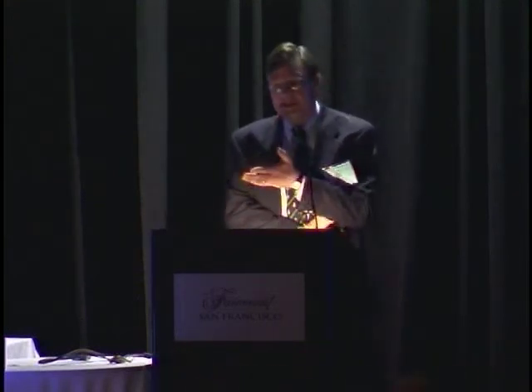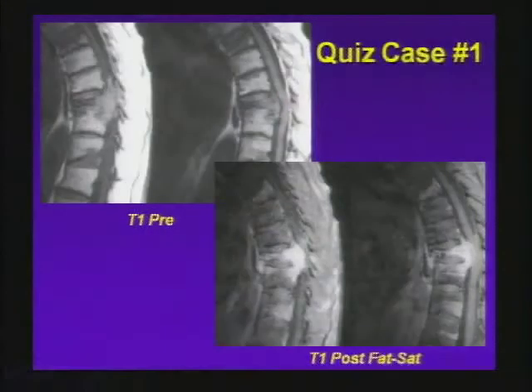And you may say, well, this is unfair. You know, I would ask for history. The history I'll give you is this is an elderly woman with a history of breast cancer who's in a nursing home and has chronic urosepsis and is very osteoporotic, and she fell out of bed and her spine hurts her terribly, and the mobile x-ray company took this horrible dark thoracic spine film that shows a new compression fracture in the mid-thoracic spine that was not there a month ago when a similar incident occurred.